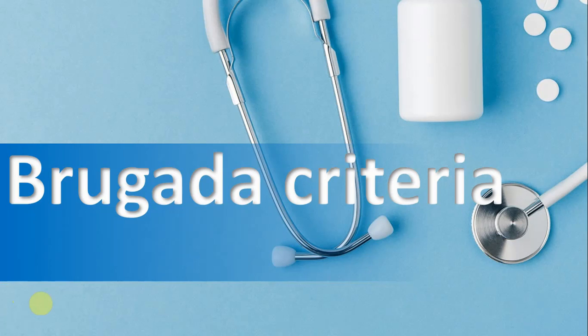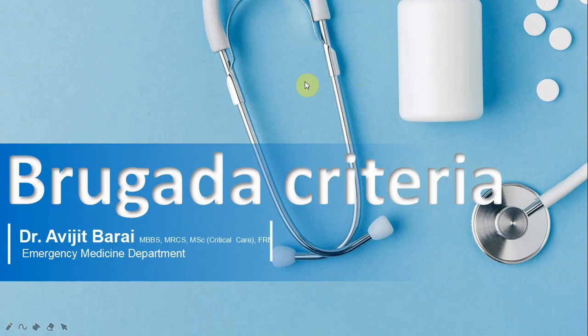We are going to talk about Brugada criteria. Many of you asked me to explain Brugada criteria in further detail, so I have prepared this video for you. Brugada criteria can be used for the diagnosis of VT or excluding SVT with aberrancy. It's a very useful tool and I found it really handy.